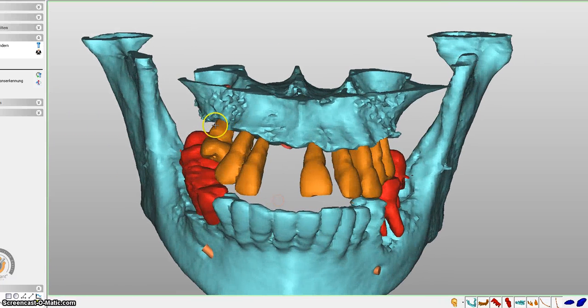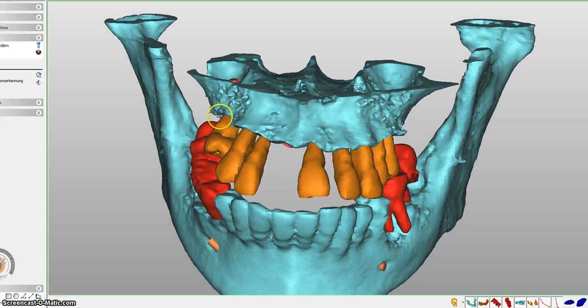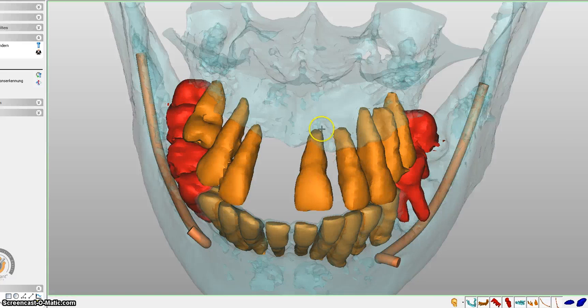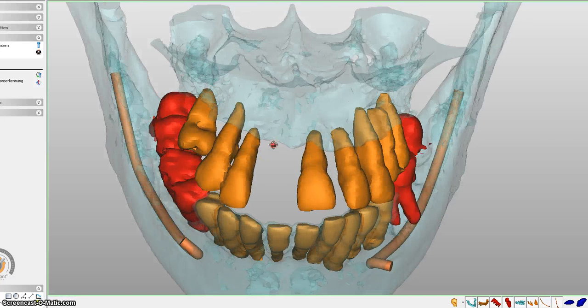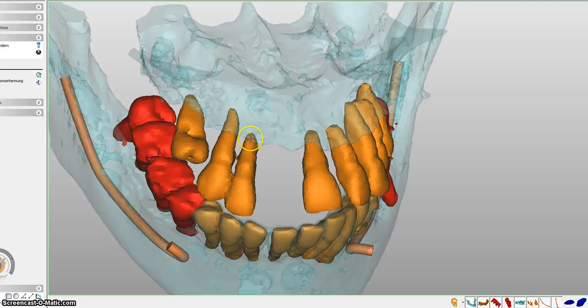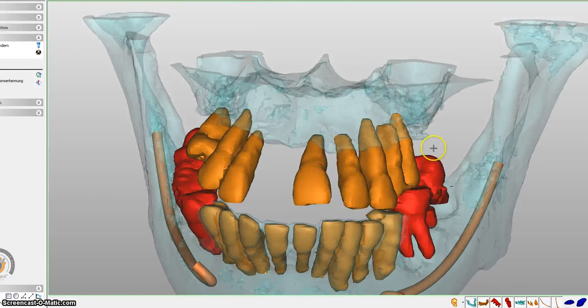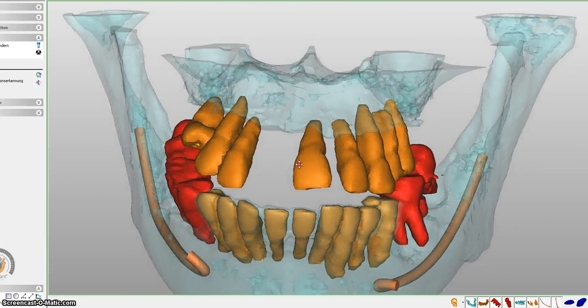What happened here is that because of a chronic inflammation called periodontitis that you have in the upper jaw, a lot of the bone holding your teeth in the upper jaw inside your mouth has gone back, and you can also see here that again the situation is quite similar to the lower jaw. It's only the tip of the roots of the teeth you have in the upper jaw that are still standing inside the bone. The bone used to be all the way up here. And I'm sure quite a couple of millimeters have gone back already, and these teeth in the upper jaw don't have a good prognosis anymore.